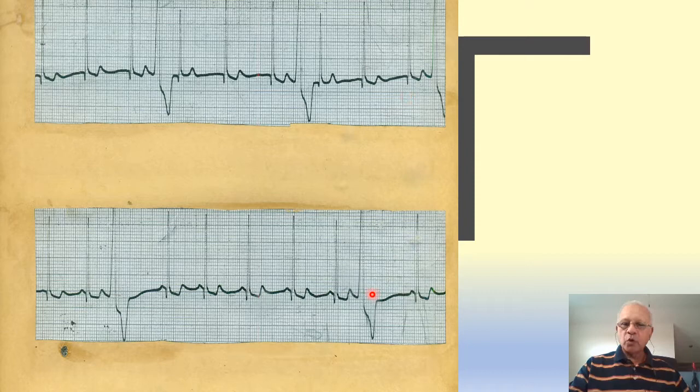Now, when you come to the lower panel, what happened? Of course, ventricular ectopics are there, but the rate becomes sinus. You can see the QRS complex is preceded by a P wave. Here there are P waves in front of the QRS complexes, right? And not only the P waves are there, the PR interval is ultra short.